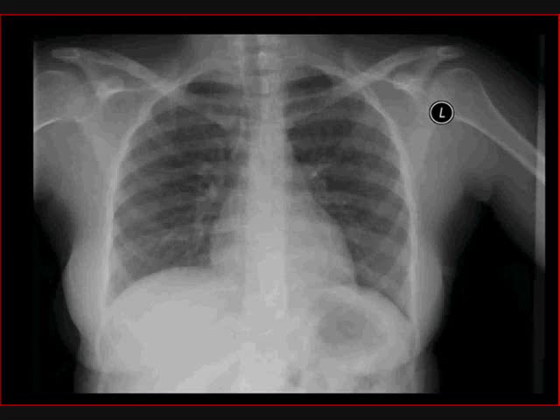So just to summarize the findings on this case, the trachea is midline, heart size is normal, the lung parenchyma is clear, there are no pleural effusions, and the soft tissues and osseous structures of the thorax are normal. So overall, my impression is that we have a normal chest radiograph in this patient who presents with acute shortness of breath.